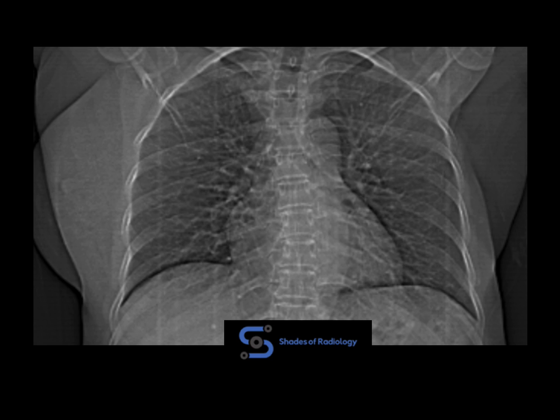Another important spotter which is usually kept in the exams and which we need to look regularly, chest x-ray, or this is actually a topogram. What is missing here? Yes, exactly, the left breast shadow is not seen. This is a case of post mastectomy on left side. Came for CT chest screening to look for metastasis. The main reason for keeping this image is to identify the post mastectomy x-ray.